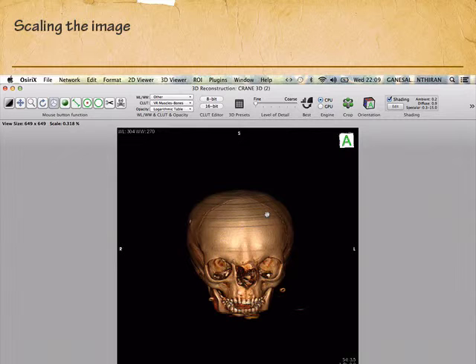So I have got 292 pixels cover a line of 13.68 centimeters.